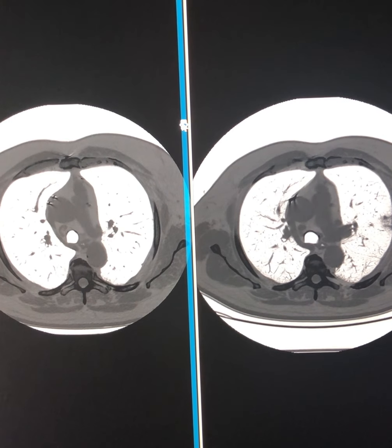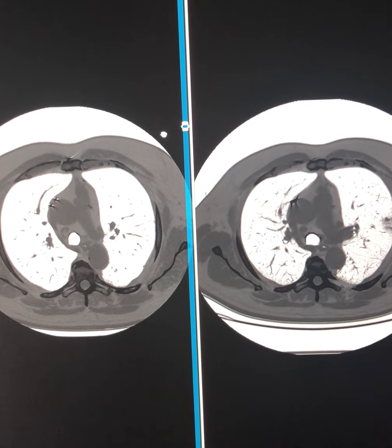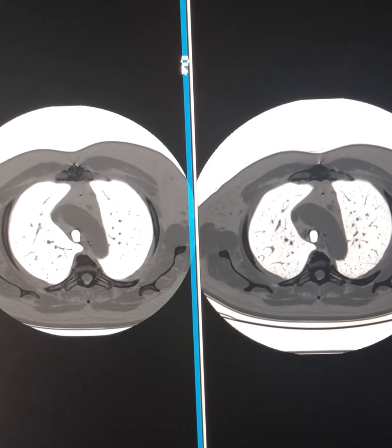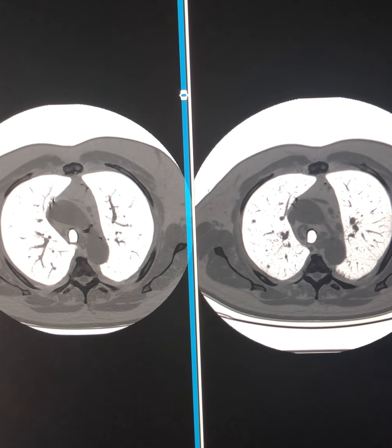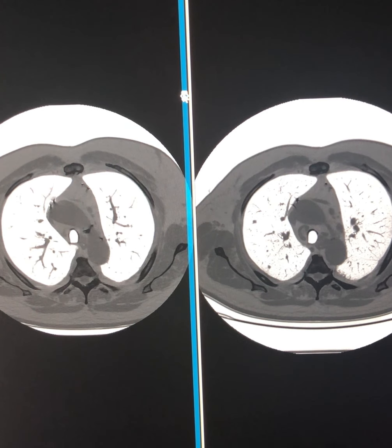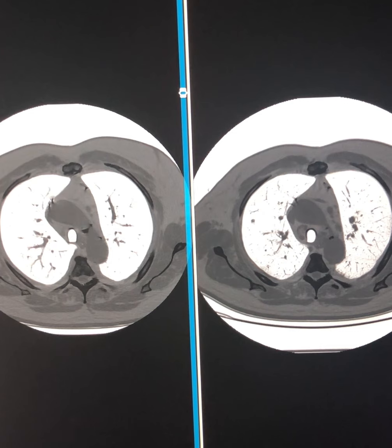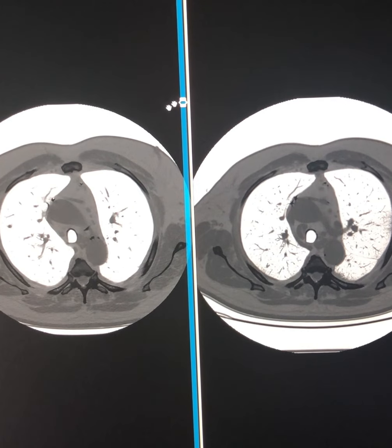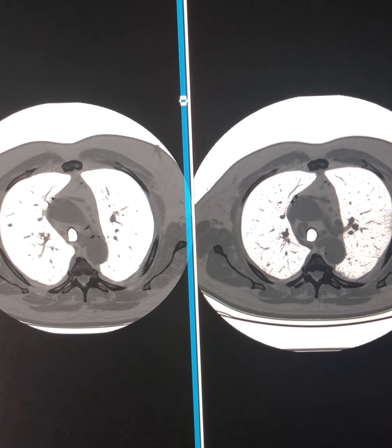So we have linked this scan around the mid-level, where you can see the ascending and descending thoracic aorta and the pulmonary trunk at this level matched in detail. And you can see that as we go towards the mid portion of the lung, the two positions of the lung nodules in the mid area of the thorax only differ very slightly. So you can see it on the older scan at this point, and you have to go only slightly lower where it can be visible on the next scan, which has greater inspiration.